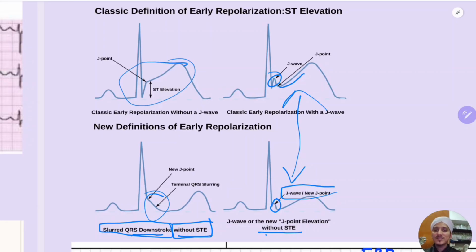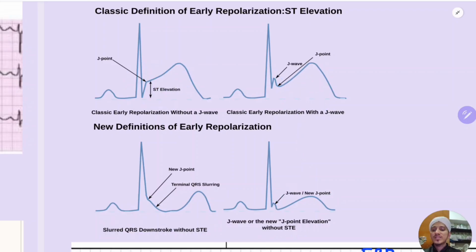This is difficult sometimes. If the patient is symptomatic, in this type, but it is again concave, it is not an MI type of wave, it is concave. But if still the patient is symptomatic, it can probably be pericarditis. And in pericarditis, if you take an ECG, you will have diffuse ST elevation.